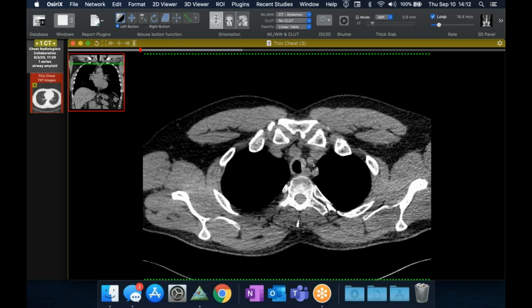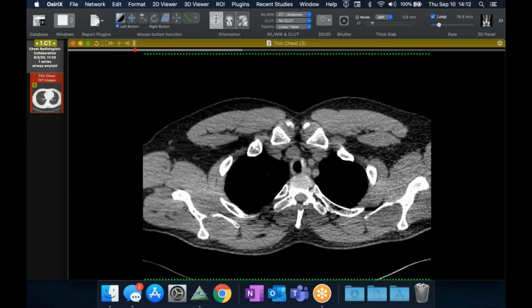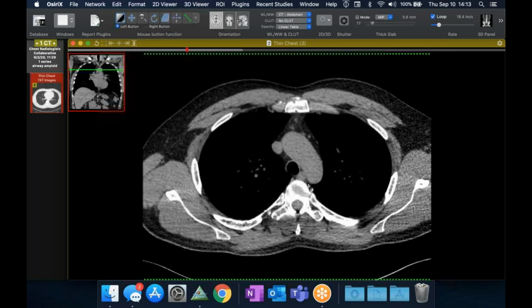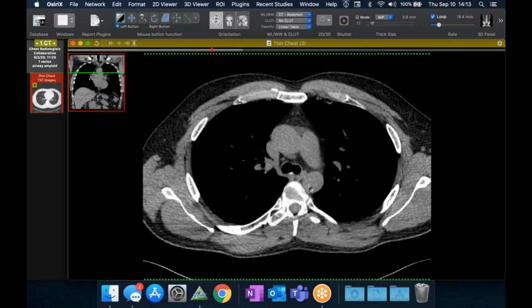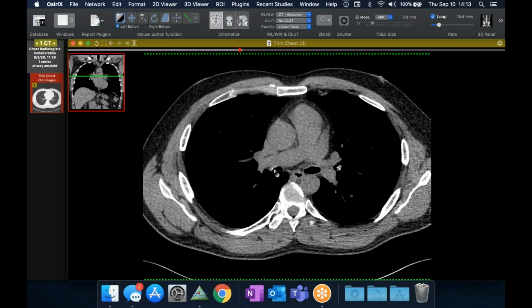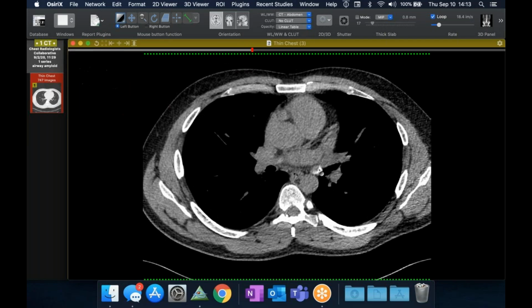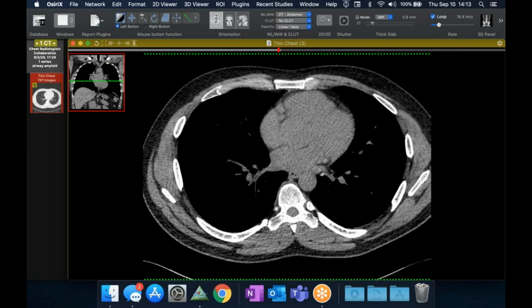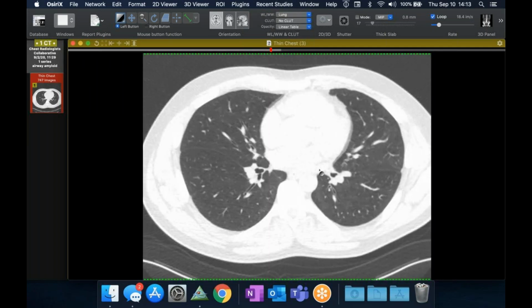seen are a lot more confluent. They look more like this, where it goes all the way around, it's nice and thick. This one had some more skip areas. And it would kind of make me wonder about something else like GPA or something, but the calcium is pretty typical down there as well. So maybe just an earlier manifestation or an earlier time period of this, but typically it's limited to the airways and it doesn't involve anything else.